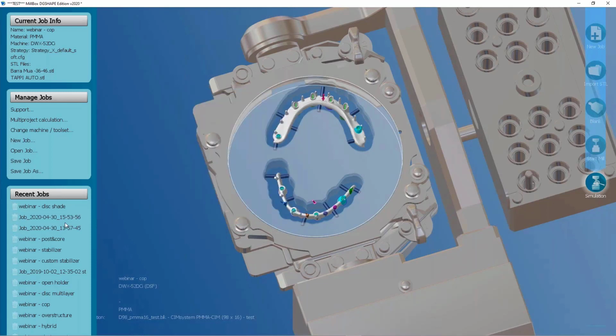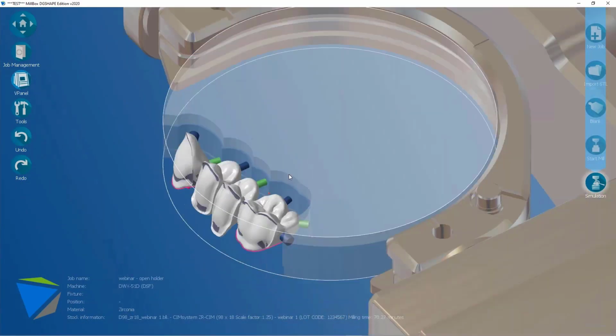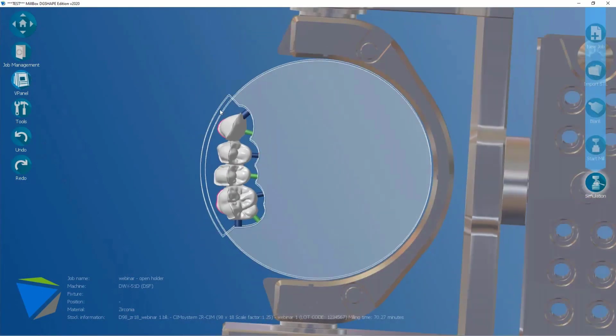So what does it mean? It means that, for example, you can use other additional particular dedicated operations in order to use the open area of the machine that the machine lets us use. And normally it's automatic. Anytime I select the 51, automatically the strategy offers me other kinds of operations, special operations we call them. For example, here, as you can see, we have the chance to put the item close to the area and then open it.